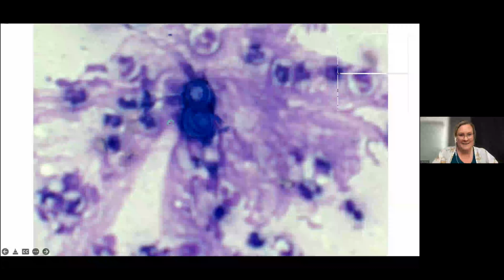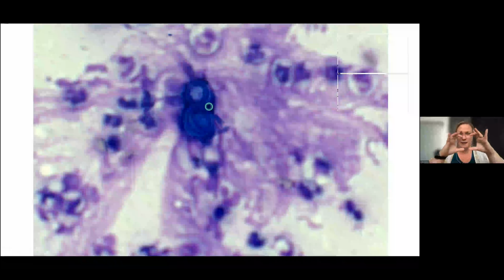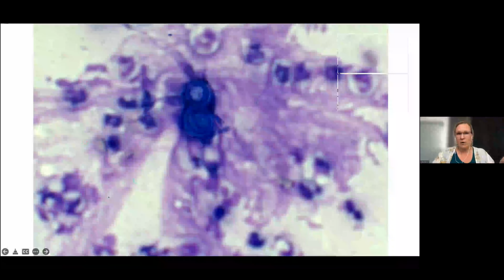And as you can see, this is a fungal yeast. This is a basophilic structure that is budding, and so it's exhibiting broad-based budding, meaning it's budding with a broad base, and it's got a double contoured refractile cell wall. And you'll notice that all of the cells behind it are out of focus, and that's because this is a 3D structure and it is very refractile. So when you focus in and out, it kind of shines at you and comes in and out of focus from the background. But this here is diagnostic in this case.